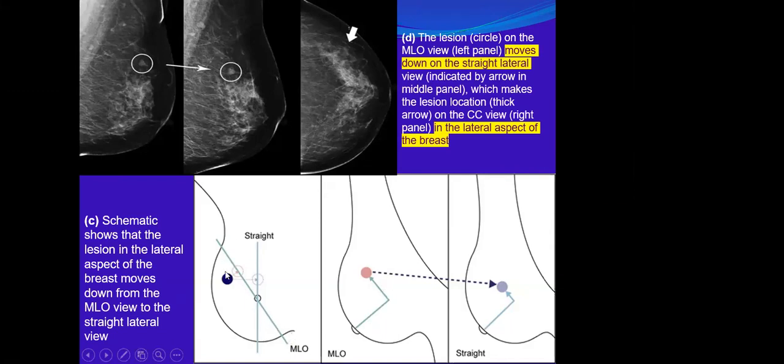So when it is getting down, it is on the lateral aspect. The lesion will be lateral.